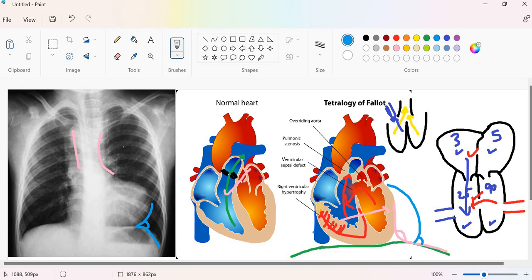So first of all, the acute left cardiophrenic angle is acute. Why? Because the enlarged right ventricle is pushing the left ventricle more laterally, so the left ventricle's relationship with the diaphragm has changed. It also makes the left ventricle look as if it is an upward-looking toe.